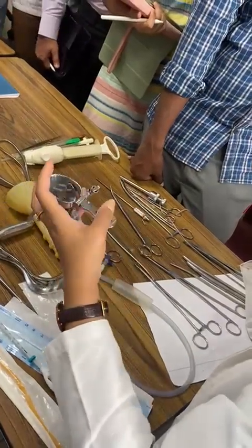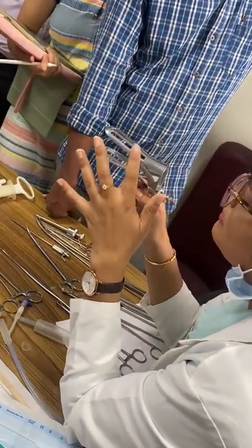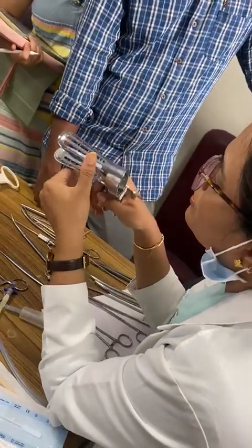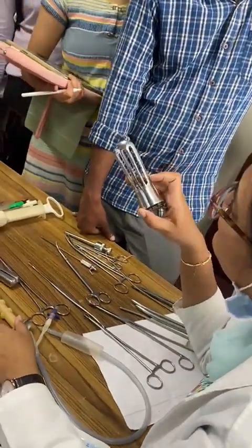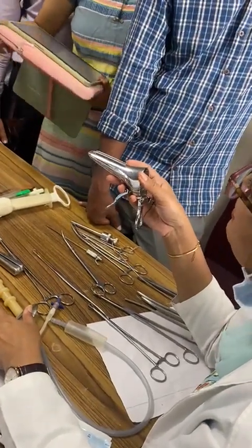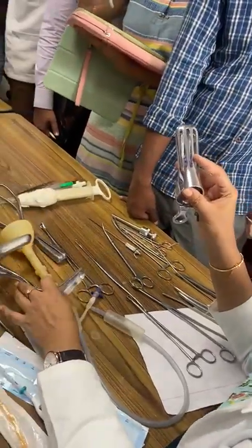Anything else? These are the two arms where we open the blades so that the cervix is visualized. And this is the most common question they'll ask for speculums: how will you introduce it into the vagina? First you have to go in laterally, and once you go inside, you have to turn vertically. Never forget this. Even with the Sims, it's the same thing.